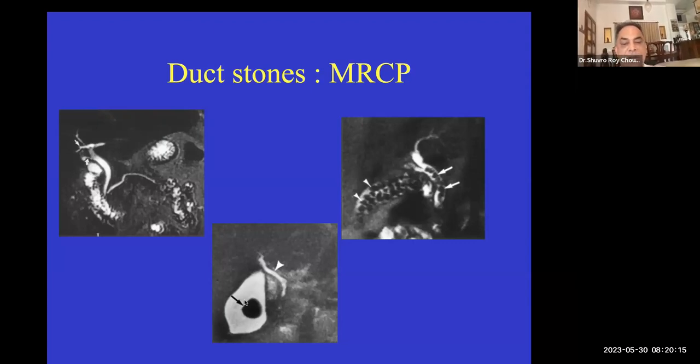So typically a gallstone will appear as a filling defect. A gallstone will appear like this, like tiny, multiple series of calculi. And you can see that Steinstrasse, it is called a line of stones, where you have got a street. Strasse means street. Stein means stone. So Steinstrasse means a street of stones like this. These are bile duct stones. And here is the cystic duct again.